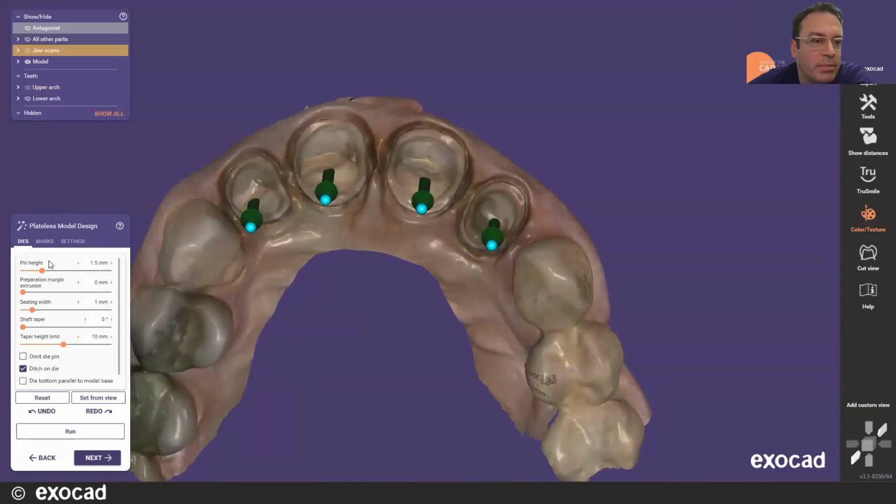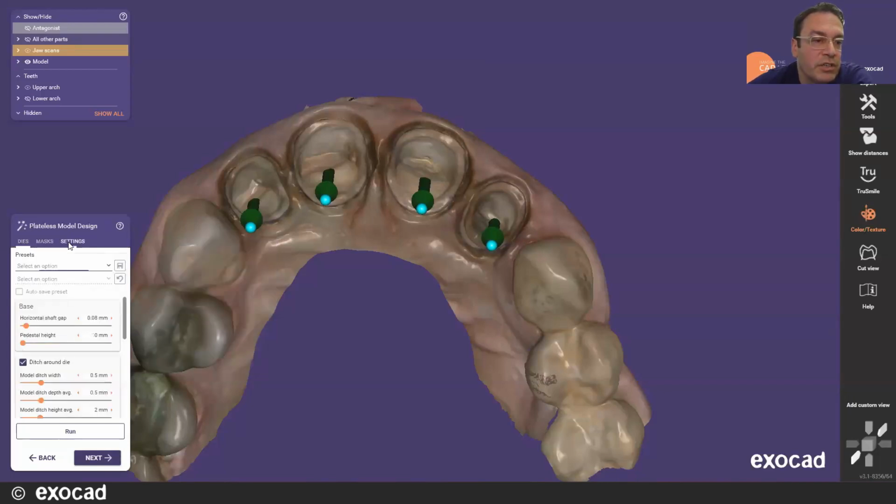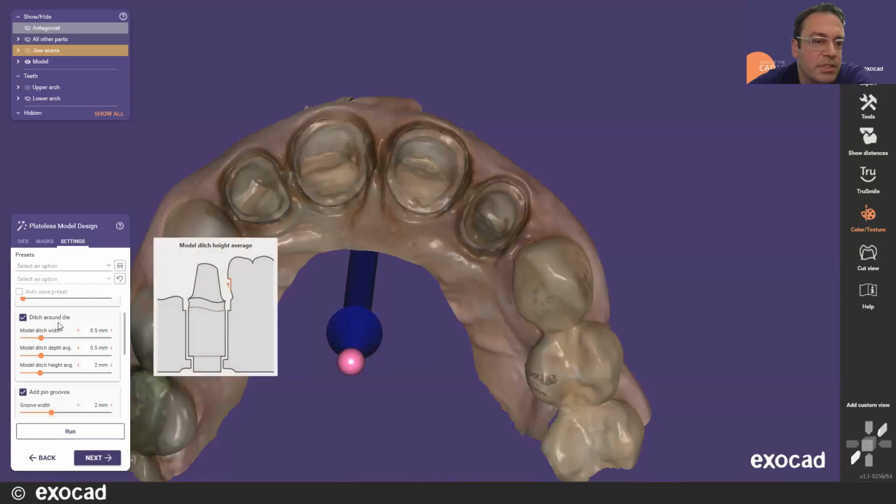Before we get there, you probably saw a couple pop-up images here. So in this version, for every setting parameter that we have in Model Creator, there's an animated GIF image that shows exactly what's being adjusted for that particular setting. We started this with Model Creator just because there are so many parameters and settings here, and sometimes the terminology might not be completely clear as to what it's adjusting.